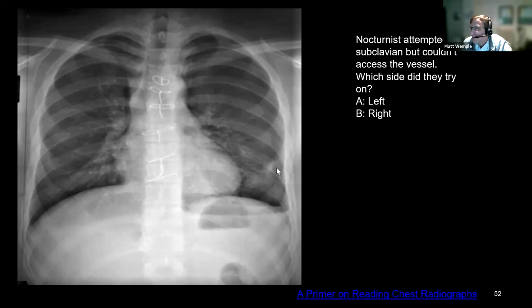I think that I see this line here. I think this is a pneumothorax, where the pneumothorax is here, and this is the parenchyma. So here, I think you could be fooled, and this looks a little deep sulcusy. We'll talk about the deep sulcus sign a little bit later. But I think this is the pneumothorax for this particular patient. There are no lung markings there, but I admit this one's actually kind of hard.